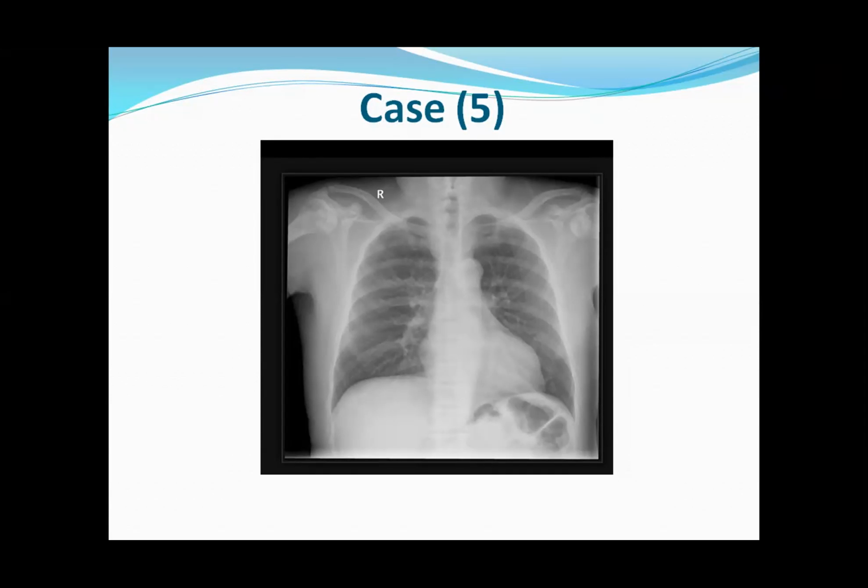Okay, what will you do next? In addition, the right humeral head appears to be sclerotic. Yes. So this is a case of sickle cell anemia with acute chest syndrome and avascular necrosis of the humeral heads. What will you do next?